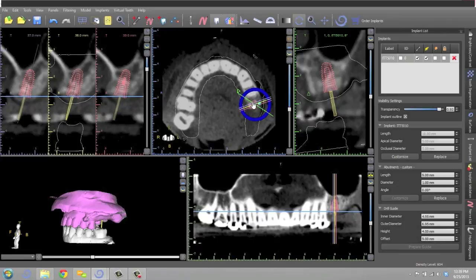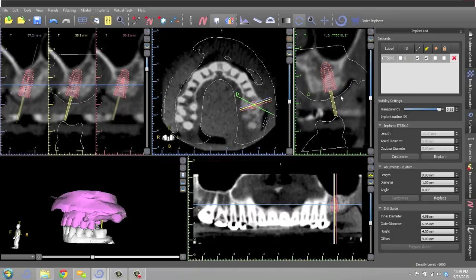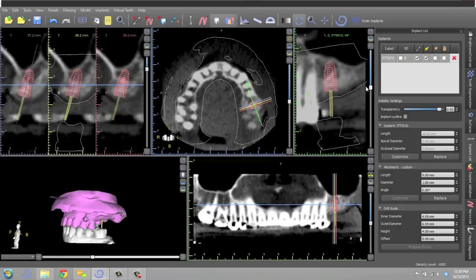So what you do is you double click on the implant, and then this little green arm with the triangle will match up. See the little triangle here? That'll tell you which side, buccal or lingual, the arm is on. That triangle is on. Okay. And so now I'm going to give you a tangential view. So this is the view you would use. You get it square, get a straight line between the midpoint of the adjacent tooth and the implant. And then that'll show you exactly what the relationship is between that root and the implant, because that's obviously a key thing to know about.